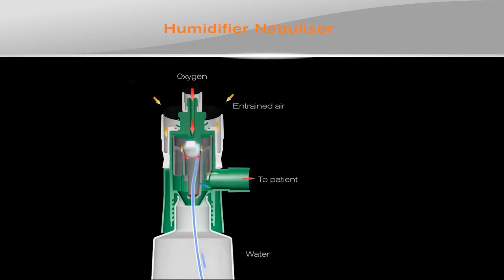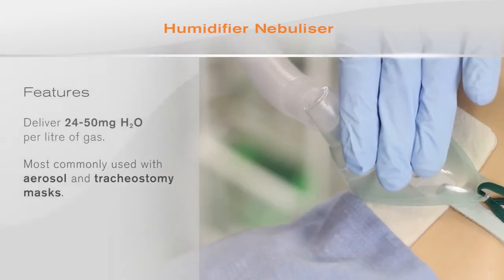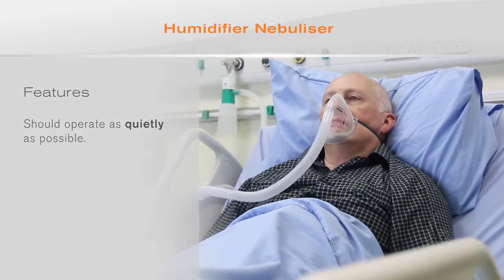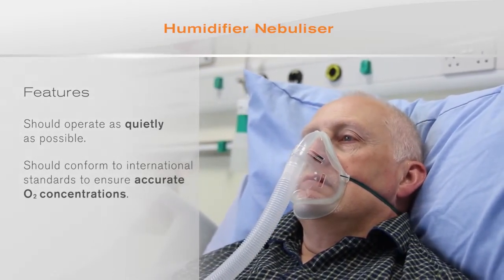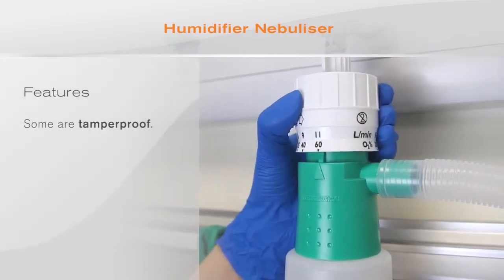Humidifier nebulizers can deliver between 24 and 50 milligrams of water per litre of gas, depending on the flow setting. Humidifier nebulizers are most commonly used with devices such as aerosol and tracheostomy masks. It is important that these devices operate as quietly as possible to ensure a comfortable environment for the patient. They should also conform to the international standards to ensure that the oxygen concentrations are delivered accurately. Some devices, for example the Aquamist, are fitted with a tamper-proof control to prevent inadvertent changes to oxygen concentrations.